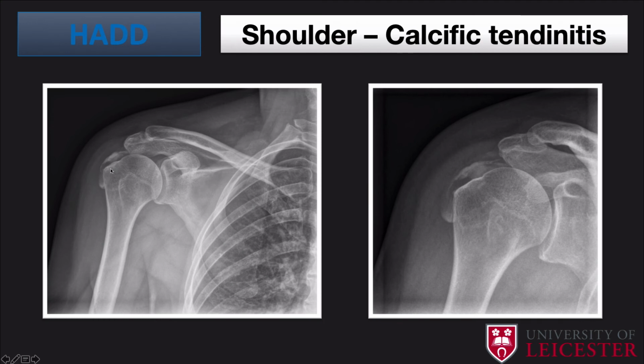And when you compare this with CPPD, where we were seeing speckled calcification, the hydroxyapatite deposition disease is so uniform. You can see it's much more uniform in high density, doesn't look like ossification, hasn't really got a high density rim or anything within the center, and it's what we call classical amorphous deposition within the soft tissues.